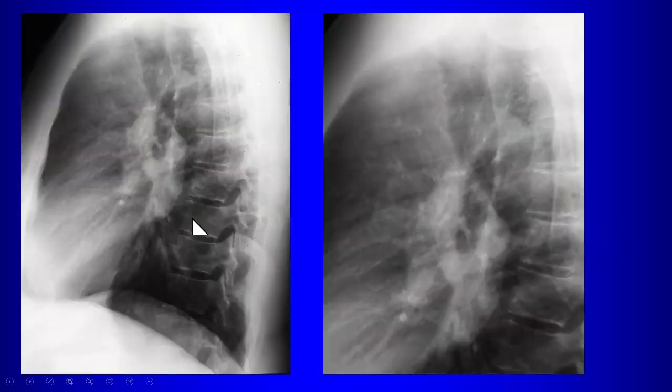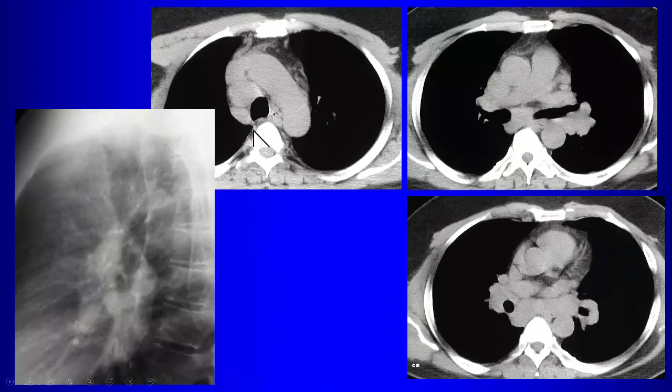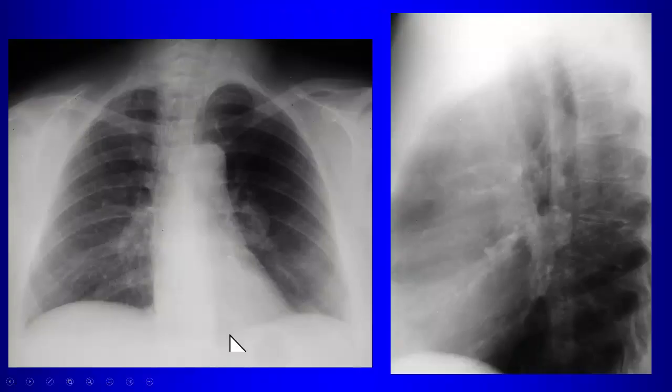But if you're questioning those abnormalities on the frontal view, well, on the lateral view, you have a clear donut here, right? So this patient definitely has something wrong in the subcarinal region, subcarinal lymphadenopathy. So now your index of suspicion of calling the hilar and right paratracheal adenopathy, you're not going to have any problems with. For that chest radiograph, here's the CT: right paratracheal nodes, subcarinal nodes, and some hilar nodes too in this patient, but nice donut sign. So you don't want to miss that on the lateral chest radiograph.